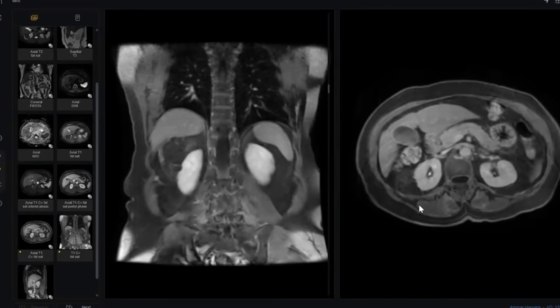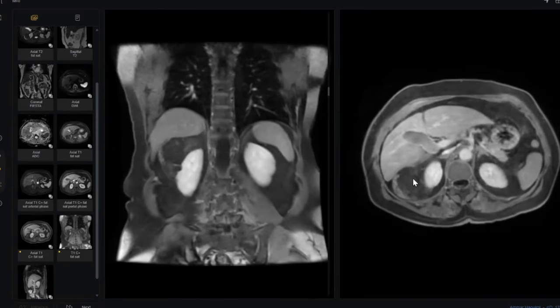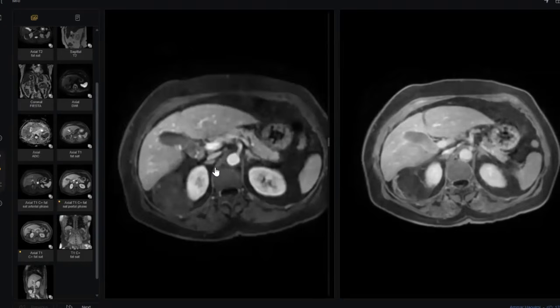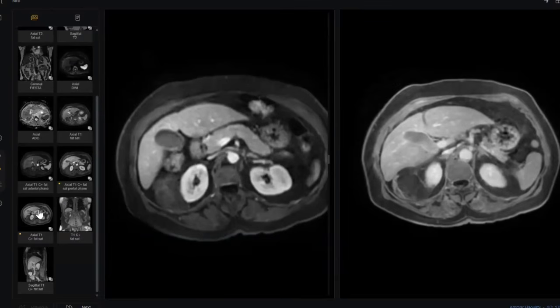Okay. There are two answers here. The first one, you told me there is a nipple sign. This is correct. Second one, look, what is this? The vascularity of this mass coming from the kidney. Very important. Third point, look here. If I told you this is the early arterial phase, look at the enhanced soft tissue. It is just mildly enhanced. Then this is the early arterial.